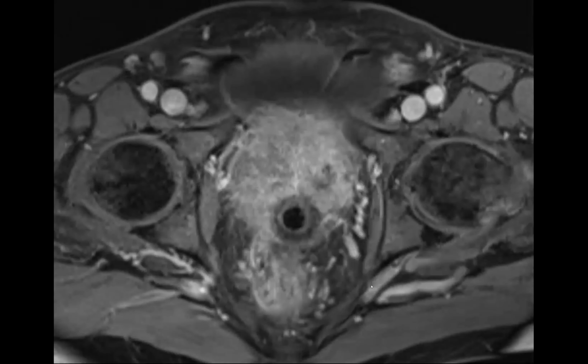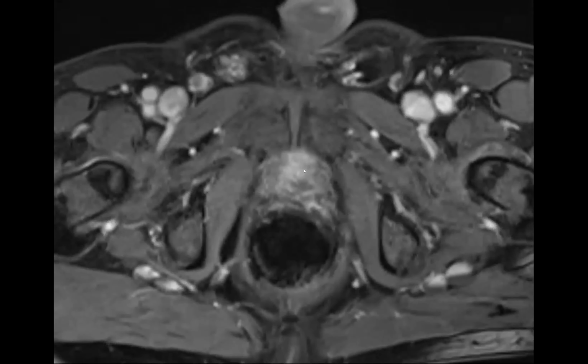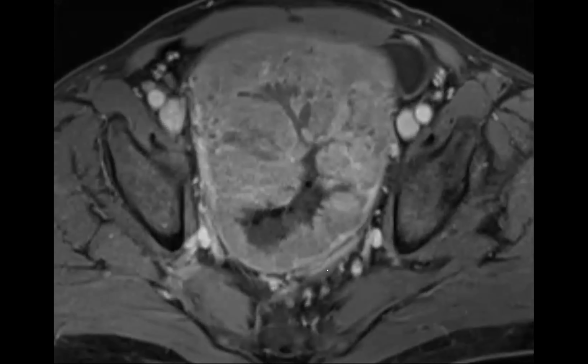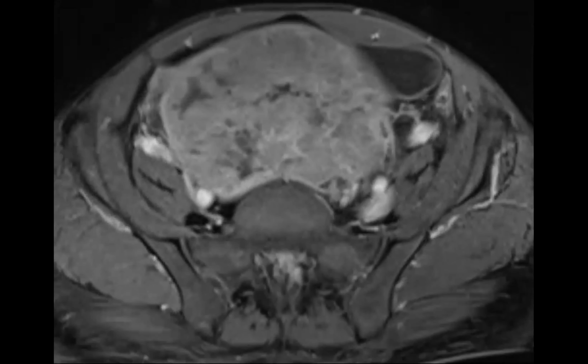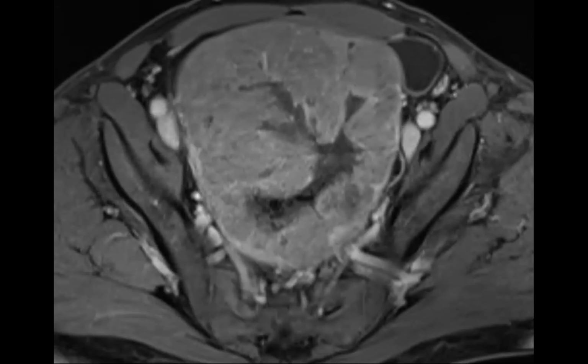Anything else on your differential? It did seem like it was affiliated with the prostate, but kind of eccentric to it, affiliated with the seminal vesicle. Somebody's chatting in. Oh, Rupa says we had a GIST similar to this. Okay, excellent. So we're thinking, is this a sarcoma? Is it a GIST? Is it a whatever? So let me just move this for a second while I bring up the next image.